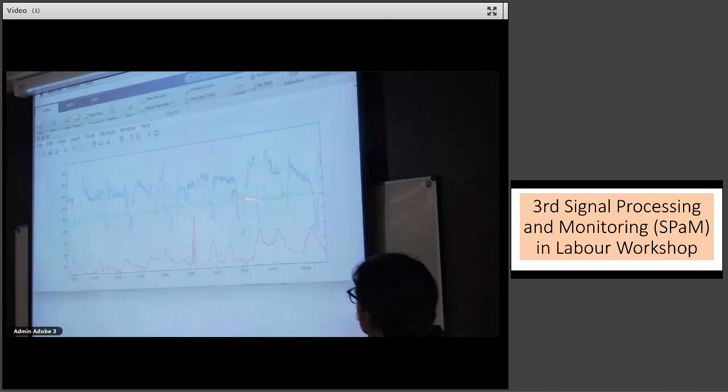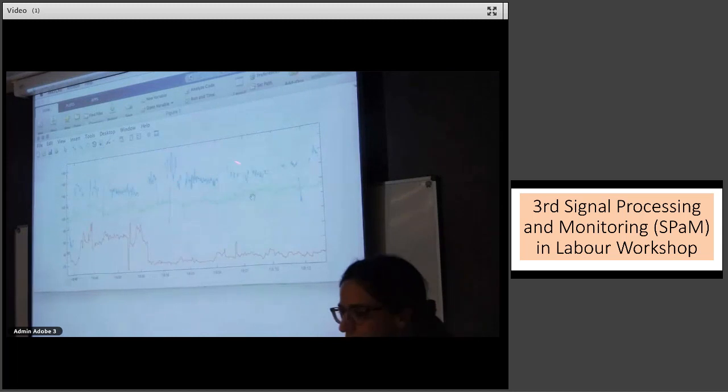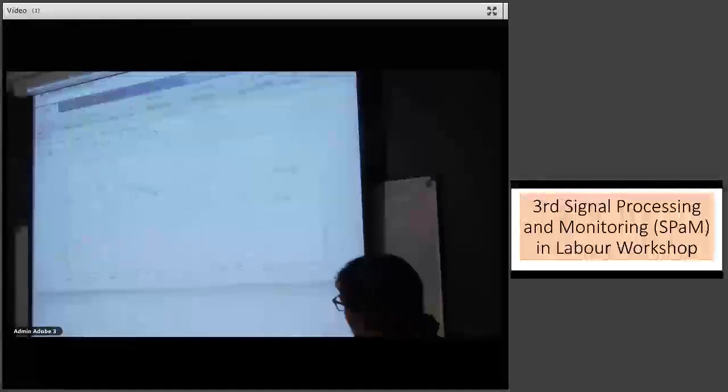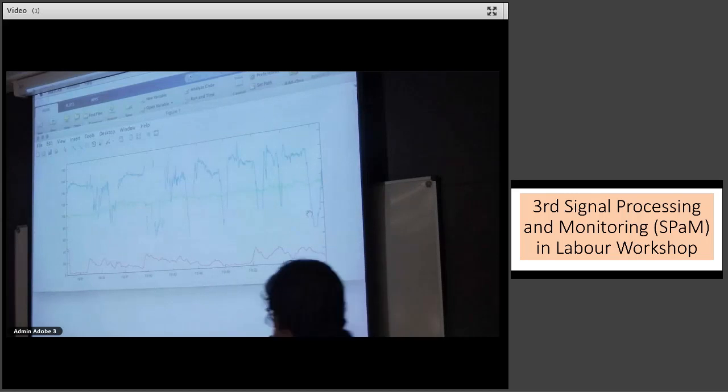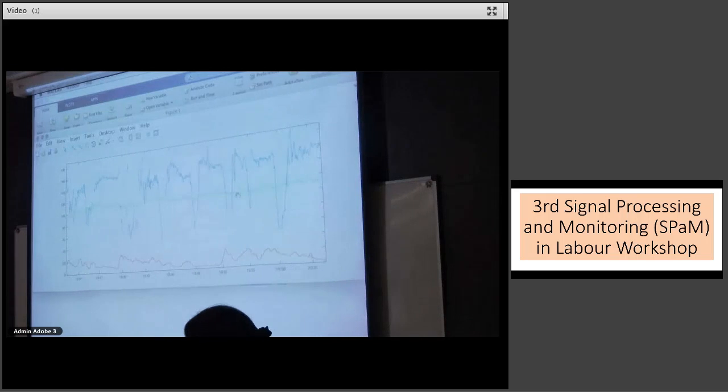Right. And obviously Oxford were happy with it, and they continued, and apparently uterine contractions are there. But is there an increase in baseline heart rate, don't you think so? Yeah, or a little bit under. Okay, we're not worried about it. Yes, please, for the sake of time. I think we should. Now I was just waiting for the end of this last deceleration. But then you lose your. Yeah, you lose because you're right.